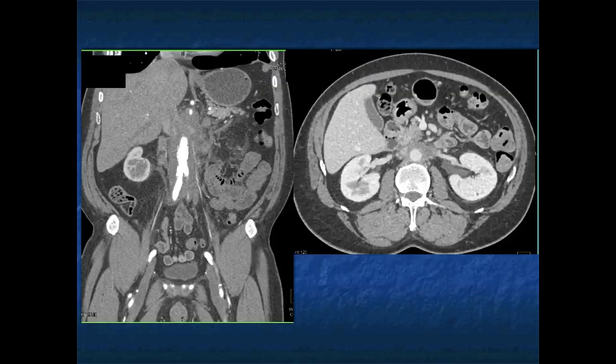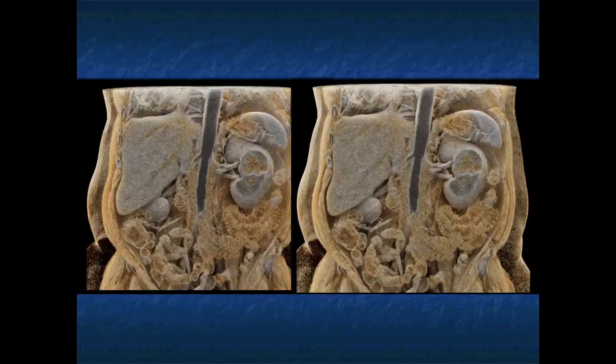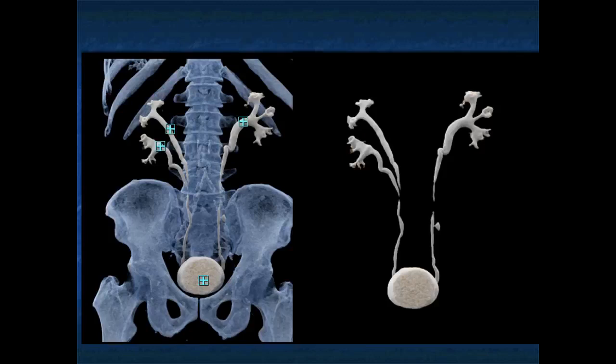There's subtle changes in perfusion, and you can see there's marked soft tissue surrounding the lower abdominal aorta and the iliac vessels. You can say maybe vasculitis. You also need to think about retroperitoneal fibrosis. On the patient's cinematic rendering, the infiltration around the IVC is nicely seen.